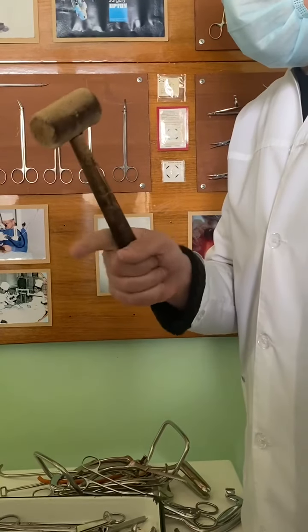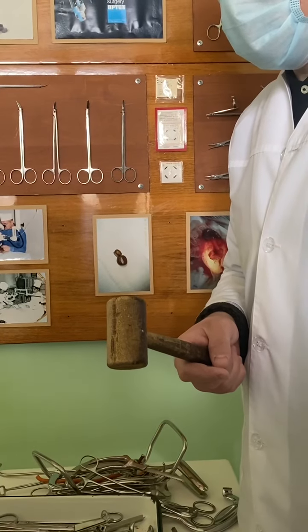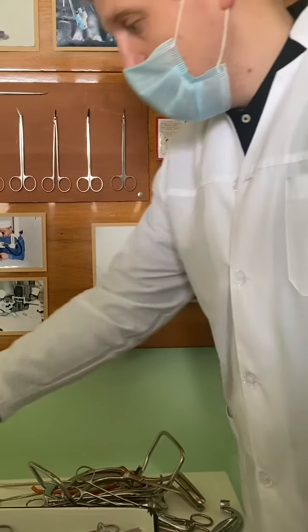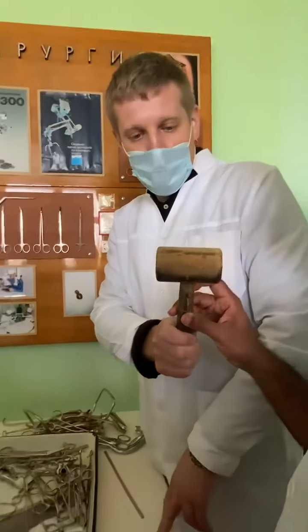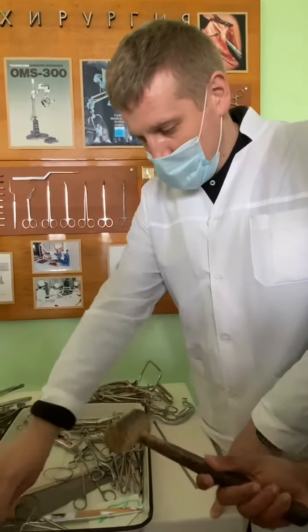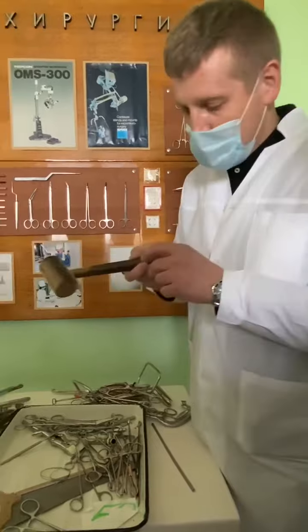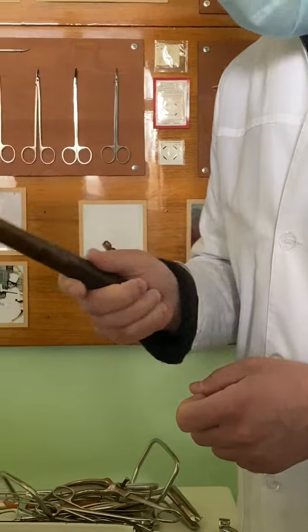And one more instrument, groove chisel. The antrotomy, or other name, trepanation of the mastoid process. Trepanation, just trepanation, is not enough. Trepanation of the mastoid process. How do you think, is this hammer made from wood? What will happen with wood during sterilization? Yeah, under the pressure, under high temperature. Let's see its structure. It's carbon. Yeah, plastic carbon.